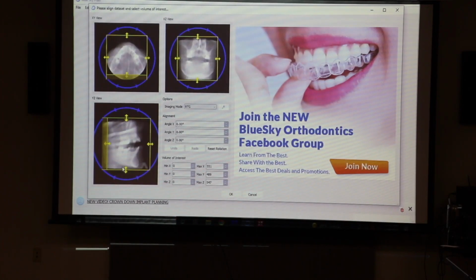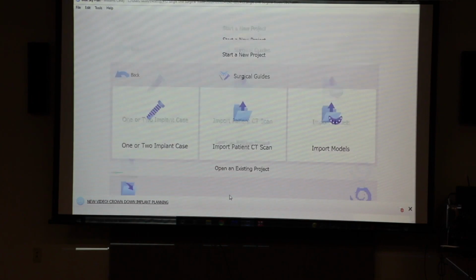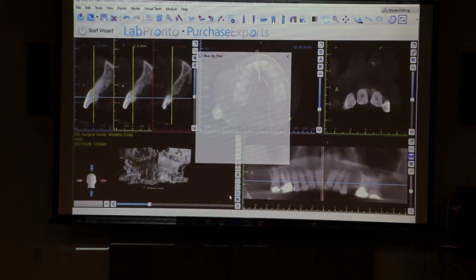We're doing number 13, so obviously we're doing a maxillary arch. So don't worry if you guys don't want to do this, but I'm going to go ahead and show you how you might crop a little bit. You can just select a smaller volume because we're looking at just the upper jaw. We're doing number 13. So I cropped a little bit. I hit OK, and it cuts off all the excess CBCT data that you might not want.